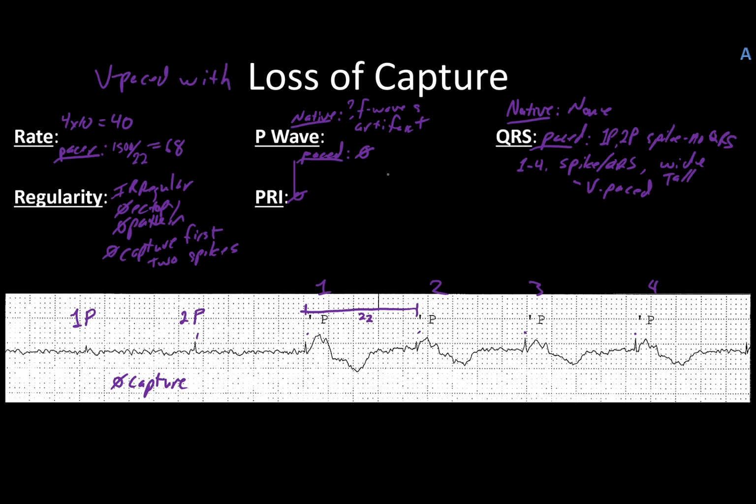Remind you what the causes of things like this can be. We can have lead fracture. We can have lead displacement.